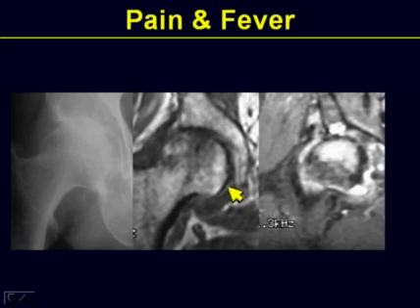And of course, once you use the fluid sensitive T2 sequence, obviously now you begin to appreciate not only the subchondral edema we talked about of the femoral head, but also that affecting the acetabular region, plus the distension of the capsule by fluid, probably very little, much less appreciated on the proton density coronal images.